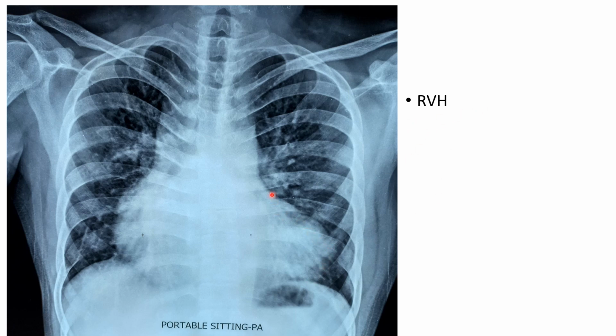And there is right ventricular hypertrophy in cases like tetralogy of Fallot, so you'll have a boot shaped heart. The boot shape in the sense that the apex is somewhere here and then it goes down here. So even here you can see typically, the tip of the apex is here and then it goes like this, right? This is a boot shaped heart. It indicates right ventricular hypertrophy.